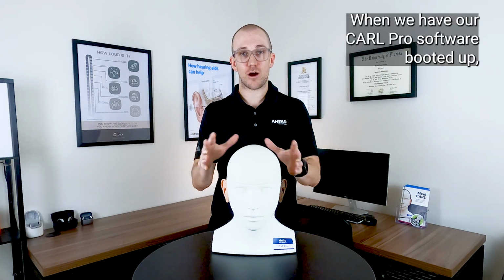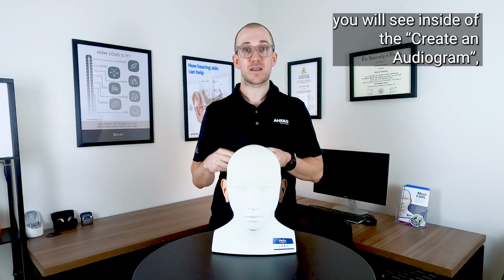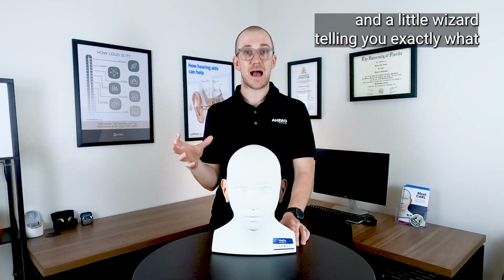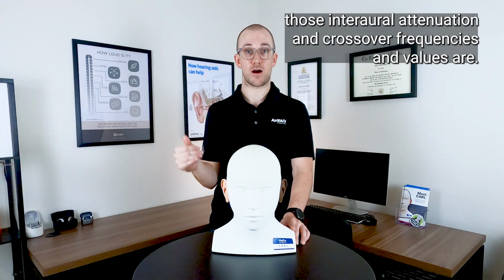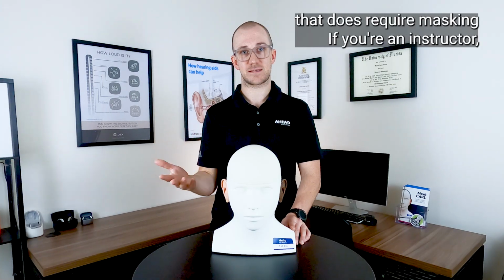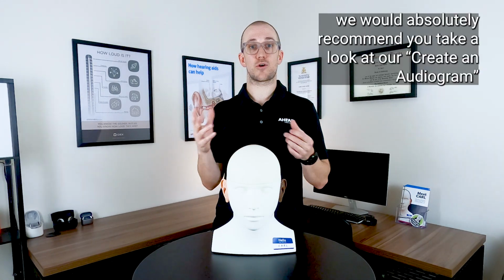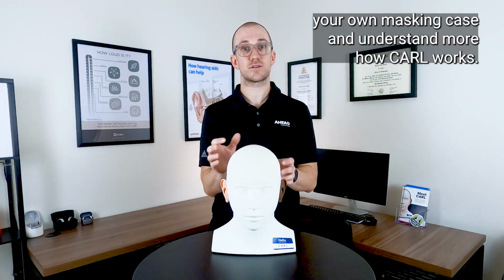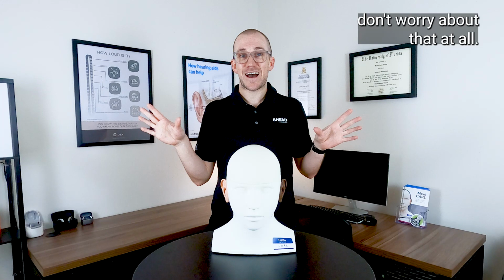When we have our Carl Pro software booted up, you will see inside of the Create an Audiogram, it will take you through a user interface and a little wizard telling you exactly what those interaural attenuation and crossover frequencies and values are, and it will coach you through how to create an audiogram that does require masking. If you're an instructor, we would absolutely recommend you take a look at our Create an Audiogram feature in the admin portal to really create your own masking case and understand more how Carl works. If you're a student or a trainee, don't worry about that at all.